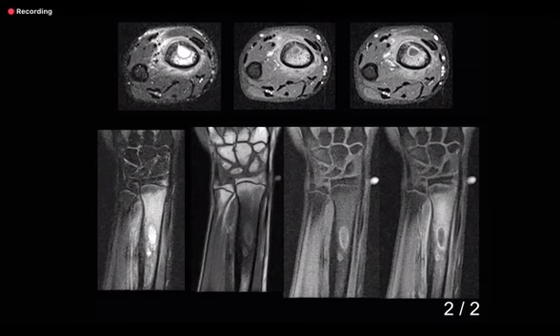So you have to understand that these two sequences, this is a STIR sequence, this is a T1 weighted non-fat saturated sequence. They are the king sequences to look at the marrow. Low signal on T1 and high on STIR means edema. There is a sign here which is a penumbra sign. The penumbra sign is seen on a T1 weighted sequence.